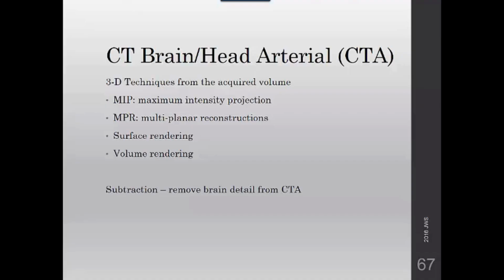A type of subtraction technique, which is usually seen in angiography in the interventional suite, can be performed as well. These are called CT angiography source images, and they provide valuable information about acute brain infarct. The subtraction maps are obtained by subtracting the unenhanced CT brain images from the contrast-enhanced CTA source images.